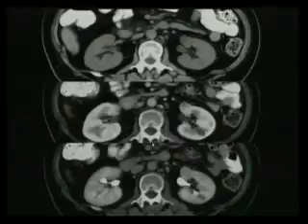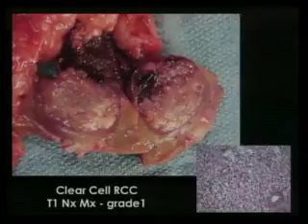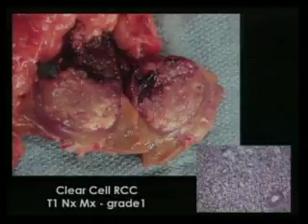Examples. Look at this patient: pre-contrast, corticomedullary phase, and nephrographic delayed phase, in which we have a rounded, well-defined lesion in the anterior aspect of the left kidney in the interpolar region. This is the typical pattern. Probably a couple of centimeters, heterogeneous tumor. I said that this heterogeneity is likely related to hemorrhage or necrosis. This is the same tumor. Look at the areas of hemorrhage. This was a clear cell.